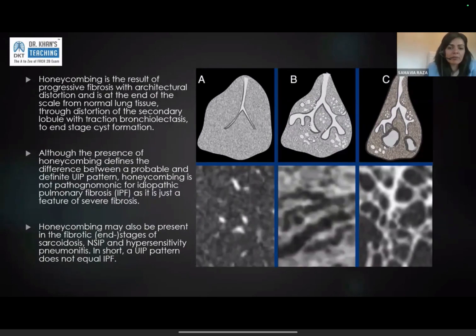And that's why traditionally we want to see 2 or 3 cysts stacking up before we call it honeycombing. The honeycombing doesn't need to be on the lateral part of the lung. It can be paramediastinal, it can be next to the fissural pleura. It can also be right in the middle of the lung, because it will look like it's in the middle of the lung, but it's actually the base of the lung. So on the basal slices, you can see honeycombing right in the middle. But if you look at sagittal, this is actually the lower surface of the subpleural surface.